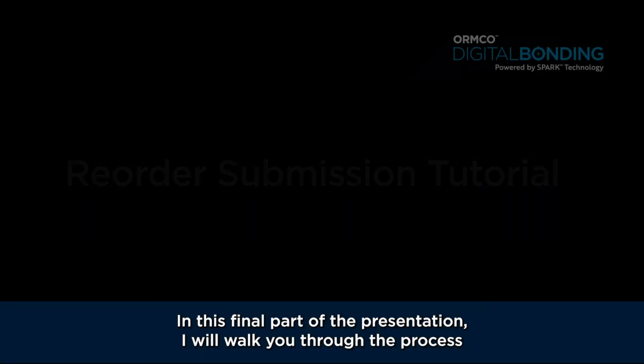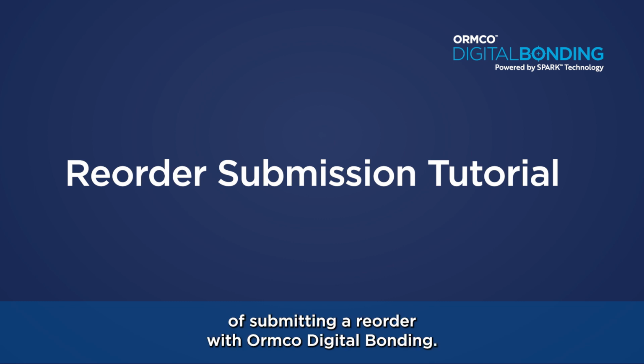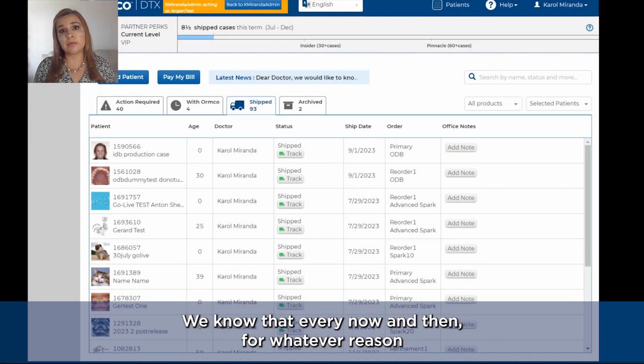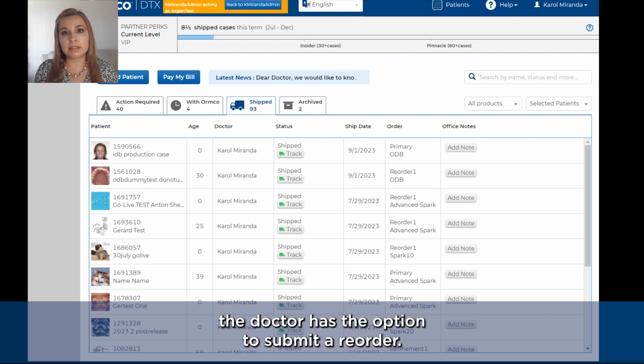In this final part of the presentation, I will walk you through the process of submitting a reorder with Ormco digital bonding. We know that every now and then, for whatever reason, the brackets fall off the teeth. When this happens, the doctor has the option to submit a reorder.